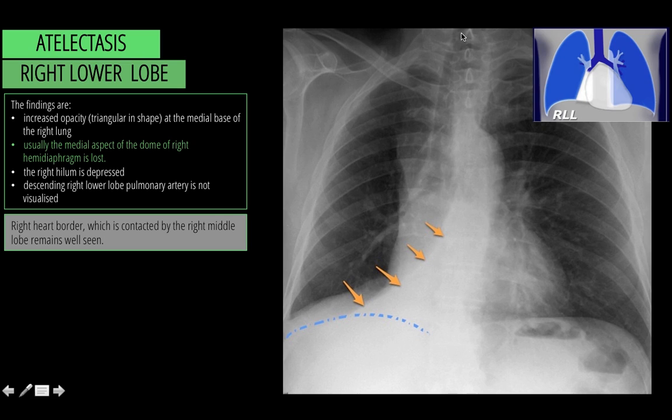In addition, we can see pulling of the airways and the trachea, as well as the carina to the right. So as a rule of thumb, if there is volume loss, usually the airways are pulled to the side of the lung that is implicated.